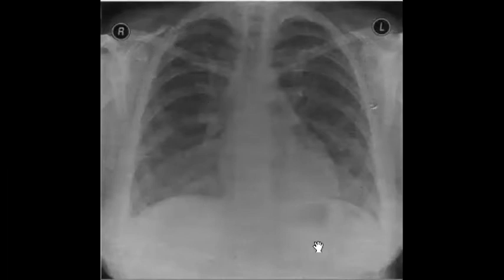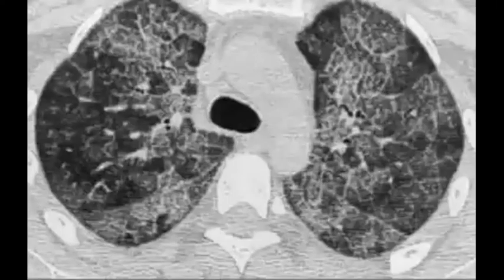bones, soft tissues, if there is any associated manifestation. Anyway, this patient did high resolution CT. Let's check how we describe high resolution CT. There are no lytic lesions until now.